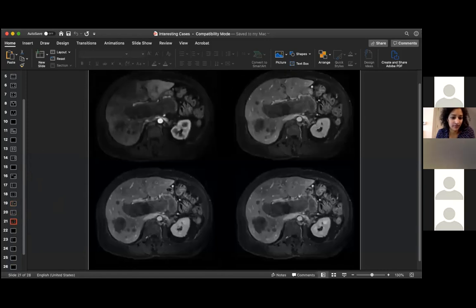And I'm going to show you the post-GAD images here. Okay, notice how it's got a well-defined contour, this abnormality. So I'll tell you that it's arising from the pancreas. Does this look like pancreatic adenocarcinoma? Everyone here has probably seen pancreatic adenocarcinoma. Does it look like that? Gitanjali is saying IPMN with malignant degeneration, transformation. And Gitanjali, are you saying that because of the cystic components? The shape of the pancreas is preserved. It looks like it's just distending the pancreas. That's why. Okay.